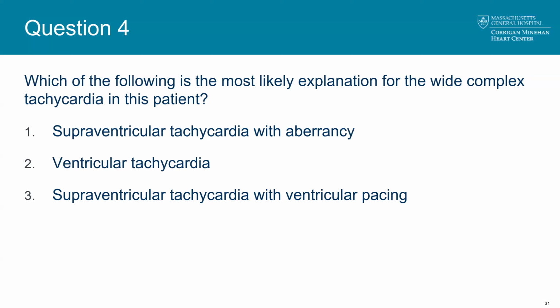So even though the EKG is not telling us anything very definitive, and even though as you take a look, there's no evidence that this is ventricular pacing either, right? So even though the answers to number one and number three are no, and for number two, we don't have a clear yes, based on circumstances alone, we've got to be suspicious of ventricular tachycardia. So knowing only that which I've presented to you here, if I were to force you to choose one of these, it would have to be VT, just because of the patient's circumstances and clinical history.